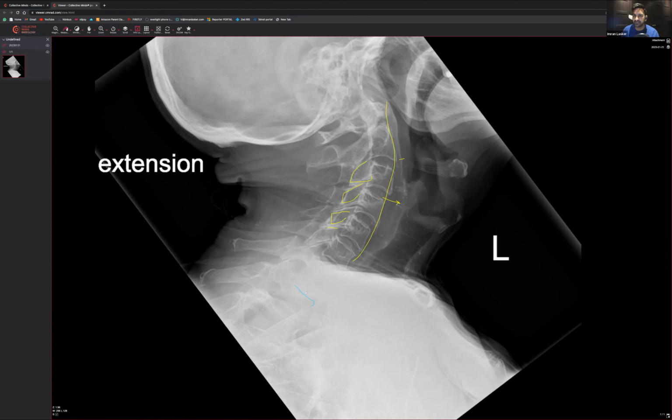Yeah, that's not great. I've literally seen situations where there are significant fractures down here, but that looks okay. Have a look at that spinous process, because sometimes you get, actually the other day, someone was doing squats in the gym, and they put the bar on there, and it must have been so heavy they actually fractured the spinous.